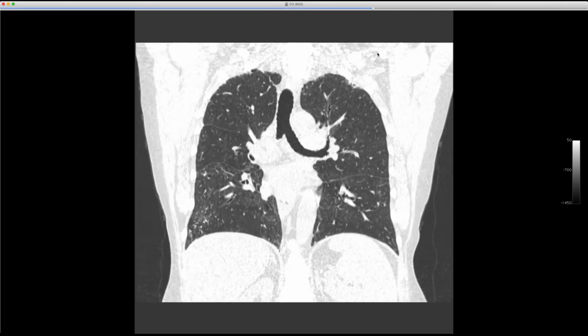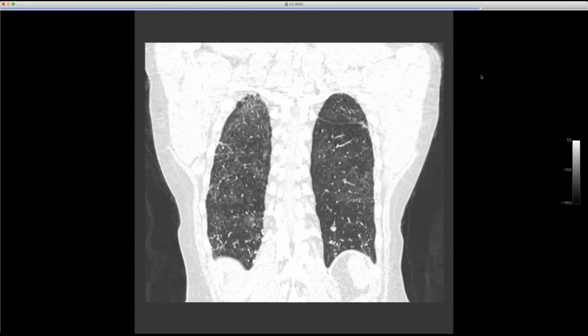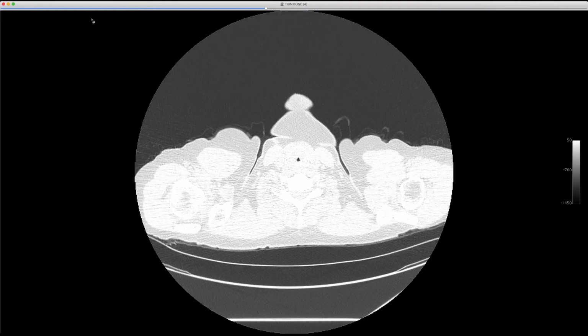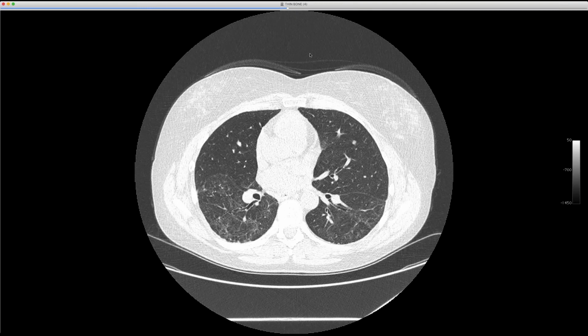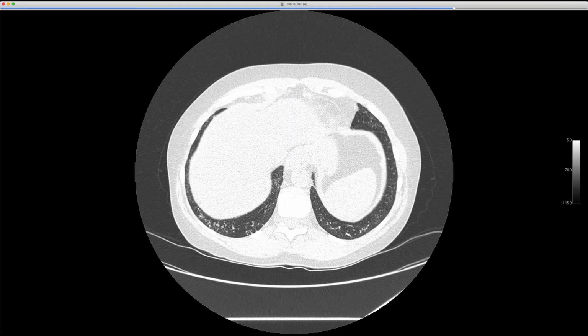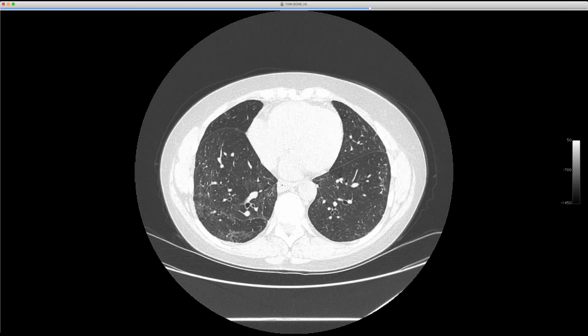But this is just a beautiful case of what I'm calling pulmonary ossification in a patient who almost certainly aspirates quite frequently. And you can even see some of them are branching, so that dendriform appearance. And that seems to be when I see this the most. I mean, that esophagus is a little ratty looking. It's an older patient, thickened esophagus, but just really exquisite pulmonary ossification. I know we've seen cases, but I seem to see this most now in aspiration. I don't know if you guys have that same experience.